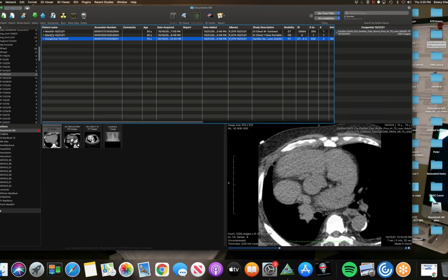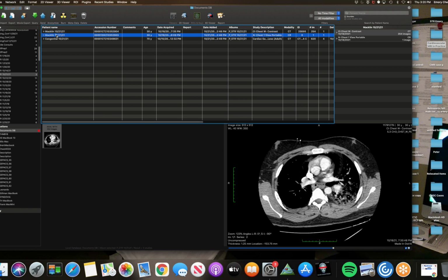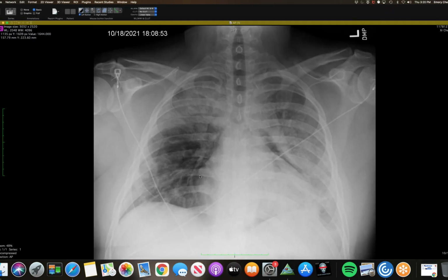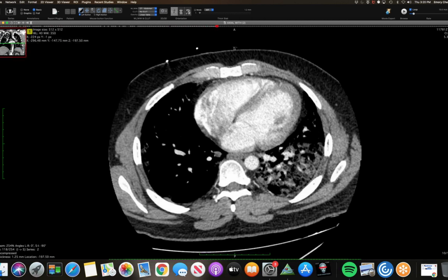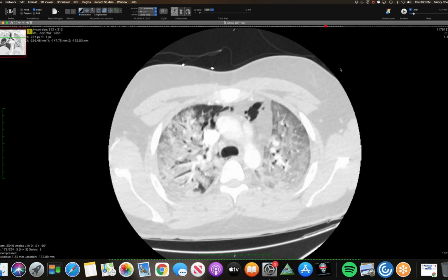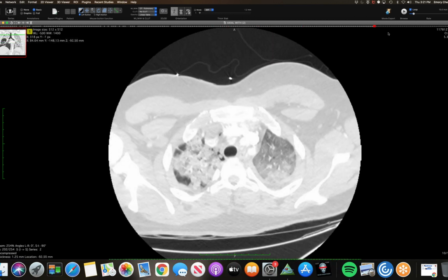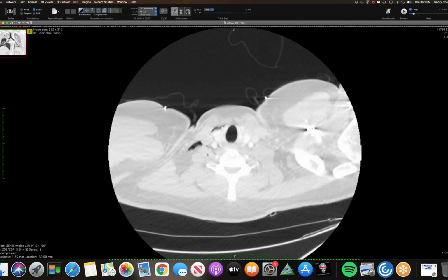And the other one I have is kind of similar to what Howard was showing. So, a 30-year-old patient with COVID, and you can see severe COVID pneumonia, opacities everywhere. This lucency here is kind of interesting. And when you look at his CT chest, he has obviously acute lung injury from COVID, but notably there's a lot of pneumomediastinum here. He's not intubated. This was right after he was admitted.